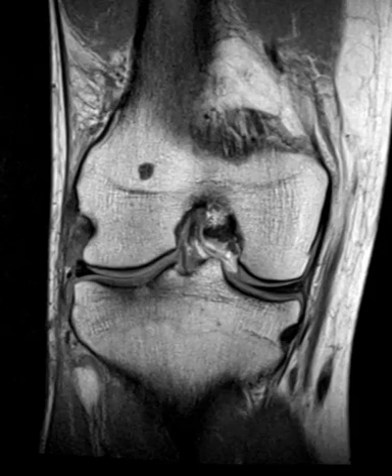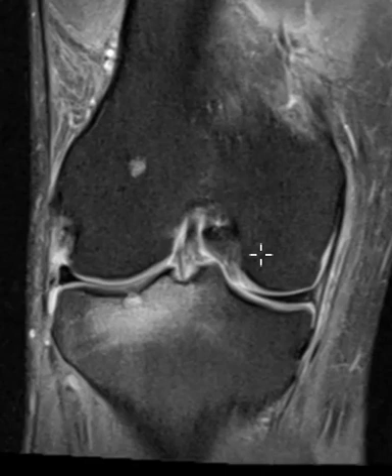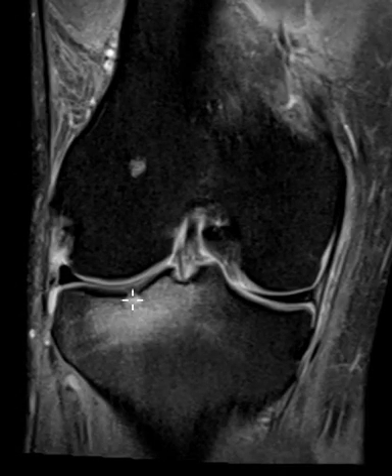If we put up another view that's sensitive to marrow and fluid, we can see here the marrow is infiltrated by fluid. Marrow should be dark like here. Instead we see this fog of marrow edema around the periphery. So this is a little bone lesion with a halo of marrow edema.